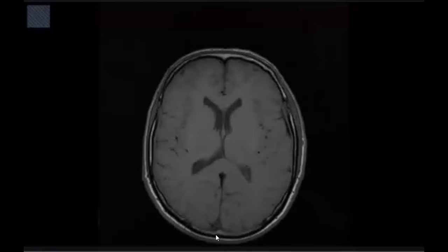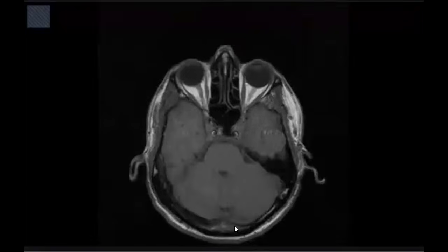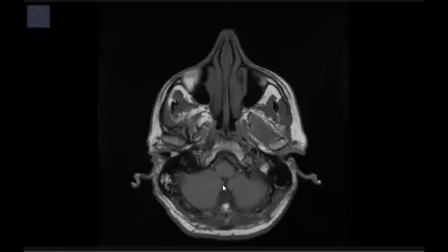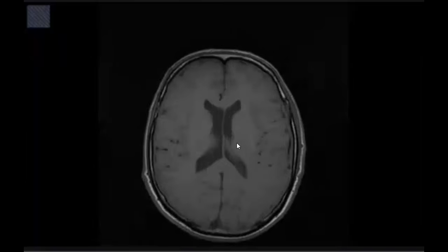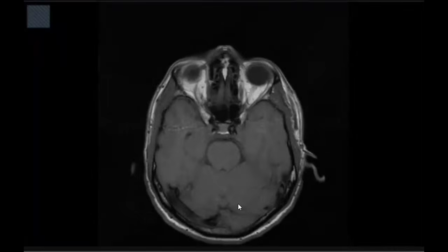As you told, there is abnormal appearance of the sinuses here. It appears rounded and distended. You can also look at the foramen magnum, no associated herniation or crowding. But there is bilateral subdural collection, which may be hemorrhagic, may be a sign of intracranial hypotension with associated rounded shape of the venous sinuses and transverse sinus on the right side.